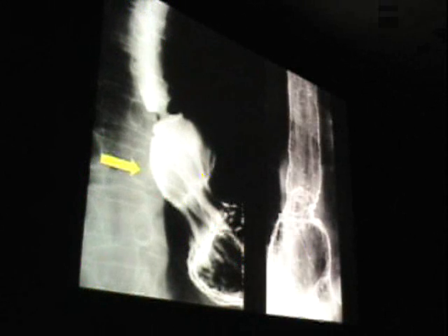Marked irregularity and distortion of the esophagus, classic reflux. I will tell you, though, that we do not do a very good job on our barium studies picking up subtle esophagitis. It's just something that's difficult for us to diagnose. Hiatus hernia, and then obviously marked distortion and irregularity.